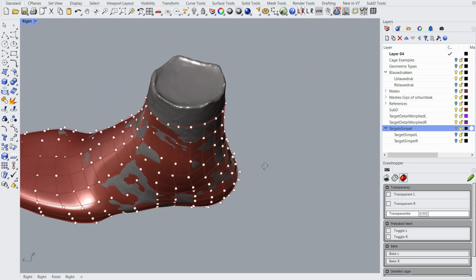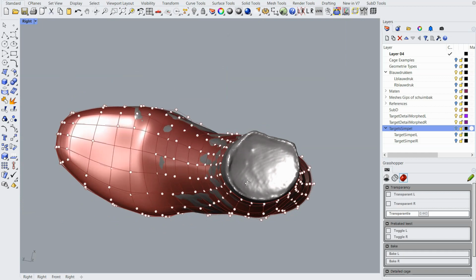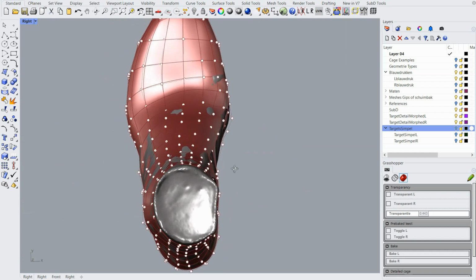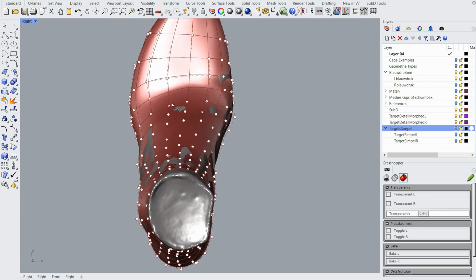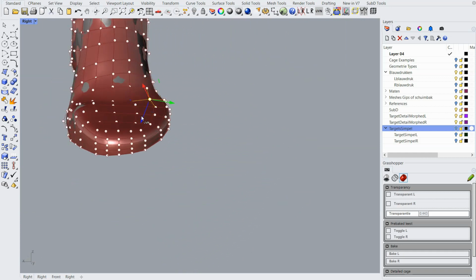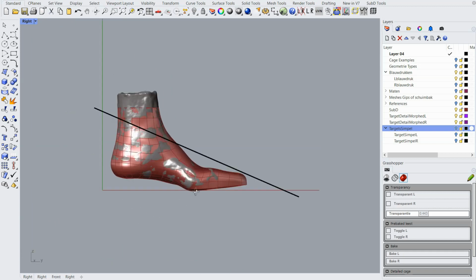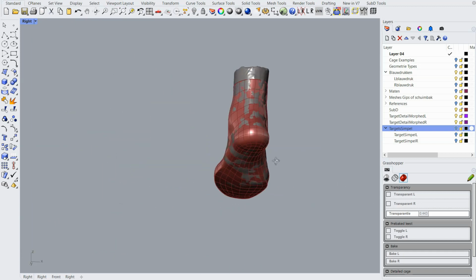Okay, and I do not use sizes, circumferences. I can do that, but you know, why should I worry about a 2D dimension when I have the 3D dimensions at hand? Right foot. Okay, I think this is okay.